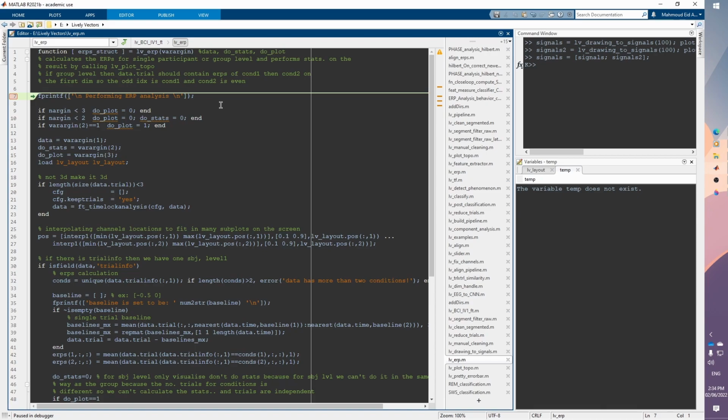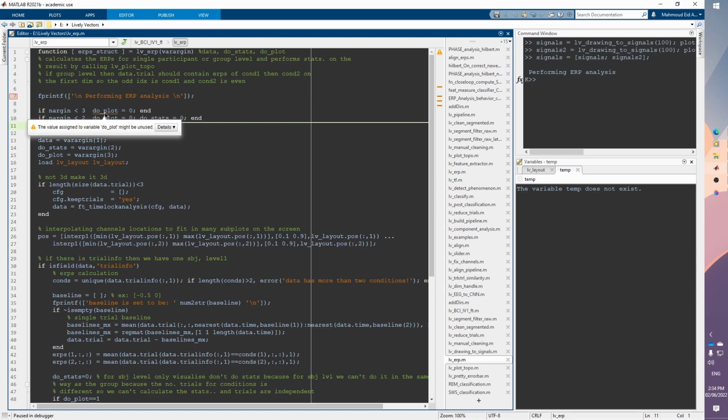So here I'm doing just printing, and here I'm checking the arguments and just assuming if there is no argument set, what kind of output I will be displaying. But here we are setting all the arguments, so it's fine.